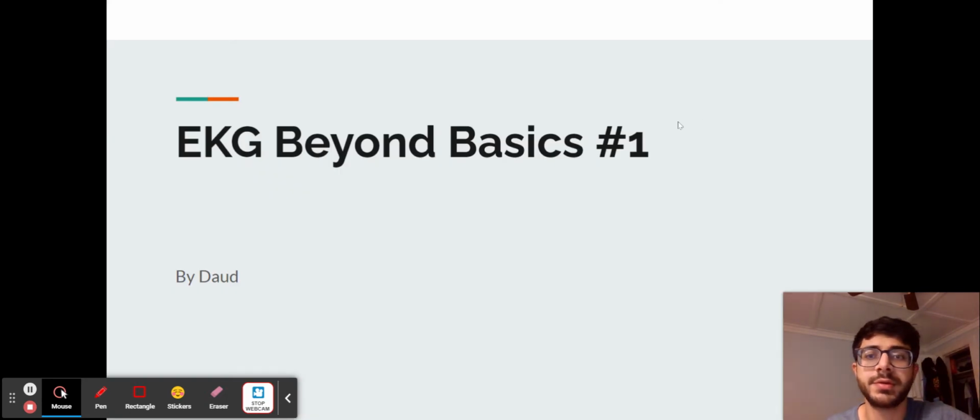Okay, guys, this is the first EKG lecture. This lecture is intended for people who know what the basic parts of an EKG are, people who know what USMLE Step 1, Step 2 level EKGs are. They know how to recognize an SVT, they know how to recognize A-fib, they know all the basics of an EKG. But when they're in the hospital and someone hands them an EKG, other than figuring out rate, they can't really figure out much. So this is for all those people.